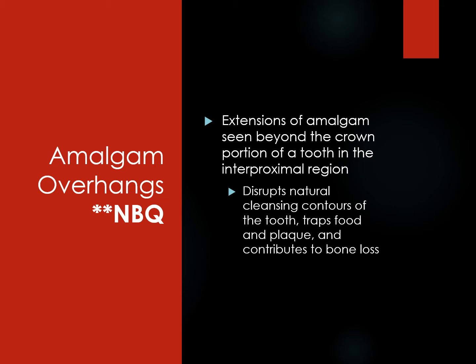And it's important that they get it perfectly flush with the tooth. They get it completely up against it so that there's no little blip hanging off the side of the tooth. You can see this on page 383. It's on figure 32-7. That number 4 at the top, you can see how that white filling sticks out the side. That is an amalgam overhang.